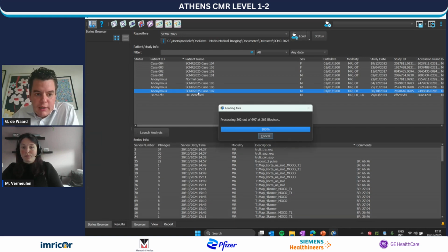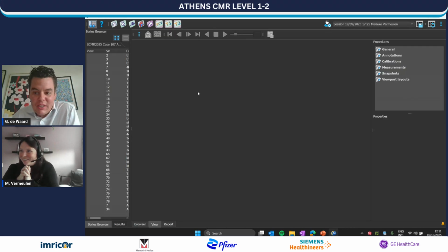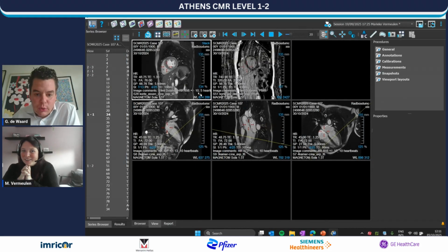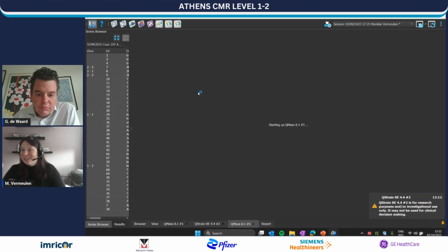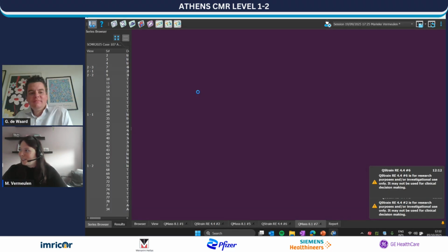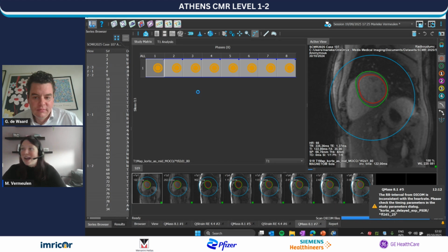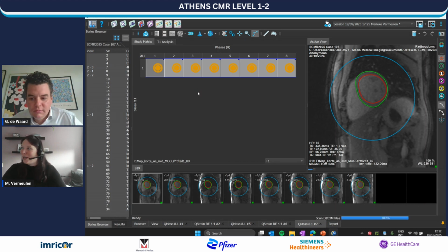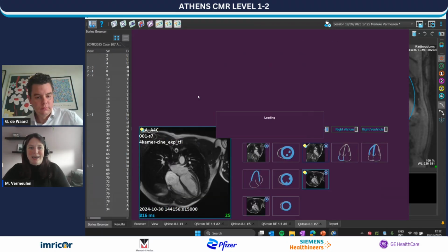We tried this case and we already saw that the software ran into a little bit of problems in this case. So that highlights the importance that you also have to look yourself. Our AIs are trained on large databases, including healthy cases, pathology cases, different types of pathologies. But indeed, when we have very severe pathology, it's never a question if an AI will fail. An AI will, in any case, at some point fail. So this is indeed a very interesting case to show.